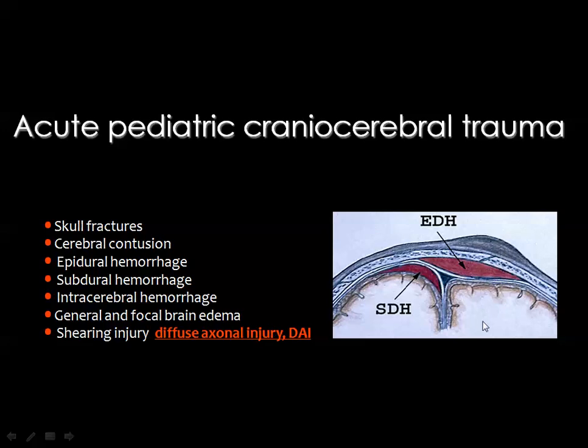The subdural blood has a concave inner margin. It cannot cross the midline. It will go within the falx or the tentorium. It is not usually associated with fractures.